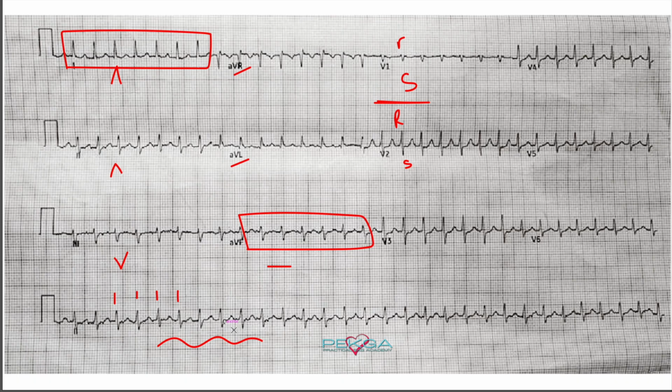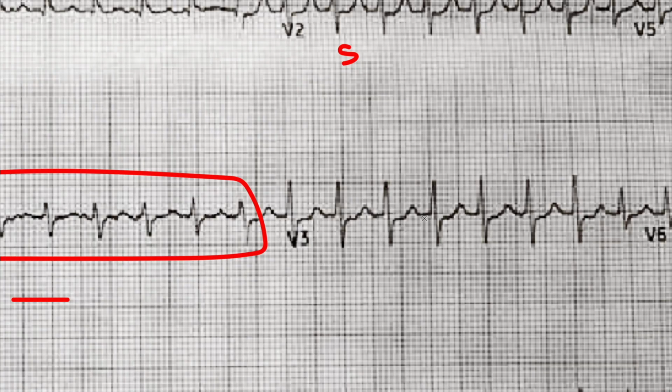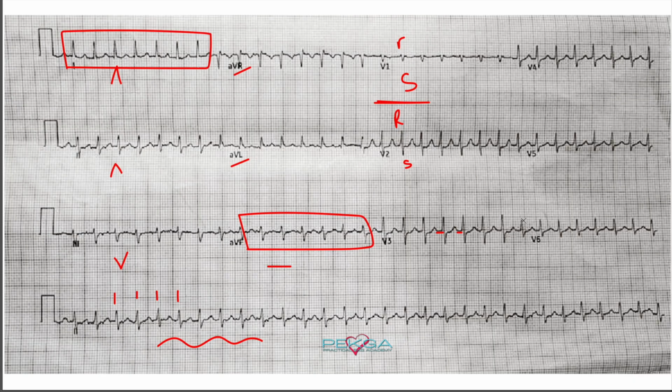It just wasn't settling down with me nicely. Another reason is that in atrial flutter, it is possible, but you rarely ever see this TP segment that is flat. That's very, very difficult to see with atrial flutter, or very rare, I should say.